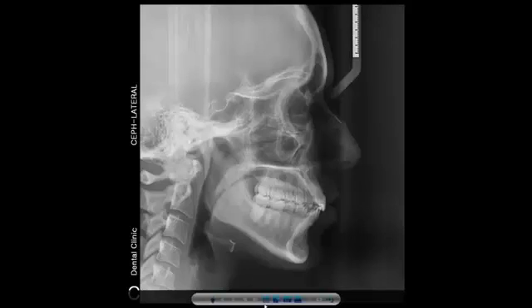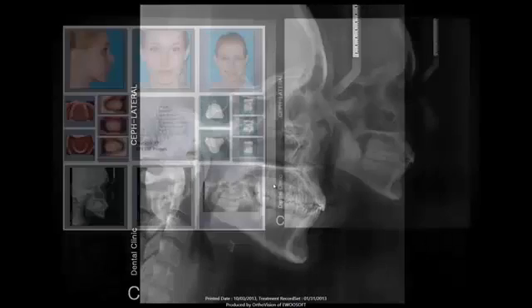Our lower toolbar also features default exporting tools. The first being Export, which allows you to save the image to disk. The second being Image Upload, which allows you to attach the image directly to your patient file in OrthoVision. Third option being Capture, which copies the image to your clipboard for later pasting. And finally, the last being Print. When you double-click somewhere on the larger image, you'll return back to the thumbnail gallery mode.